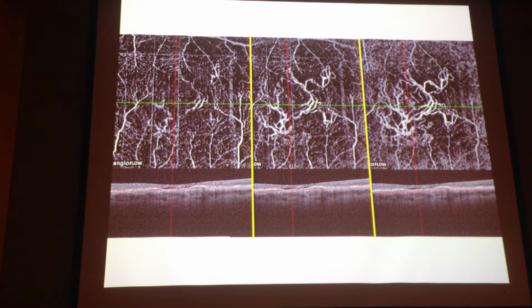And so, as we were used to do with a normal cube, with a normal OCT, where we have to look at all the B-scans, here we actually have to see all the slab, because the lesion can change in location just because there is no fluid after the treatment, and the lesion is going down, and so you don't see it anymore, but in fact it's still evident, just changed location.